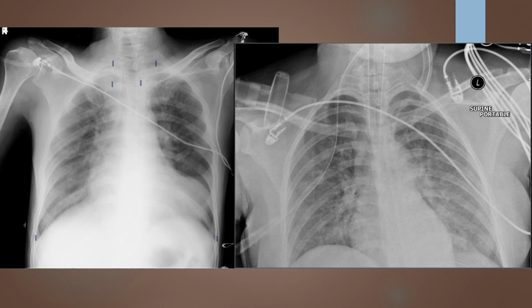Secondly, I'm going to look at my mid-coronal plane for tilting. So quickly, I'm going to go up to the apex and estimate the distance between apex and clavicle. I'm probably close to an inch here. So the coronal tilting is probably pretty accurate, but let's go ahead and check our manubrium. We've got 1, 2, 3, 4. Here's our fourth thoracic vertebra. I can see the manubrium just superior to that, so that positioning is pretty decent.